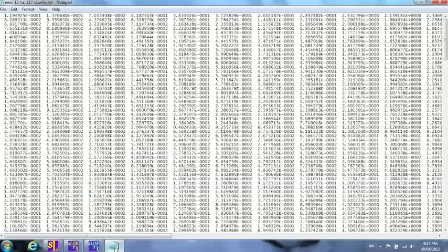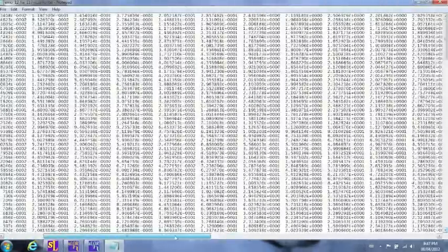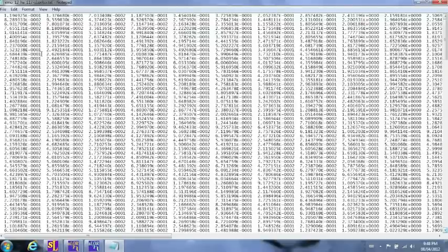These text files hold the average activation for each ROI for each time frame in the epoch. There's one column for each ROI. We have 27 ROIs defined, so there's 27 columns. And we have one row for each time frame in the epoch. Since our epoch has 256 time frames, we have 256 rows. You're now ready to import this text file into SPSS and run statistics on your localized activity.